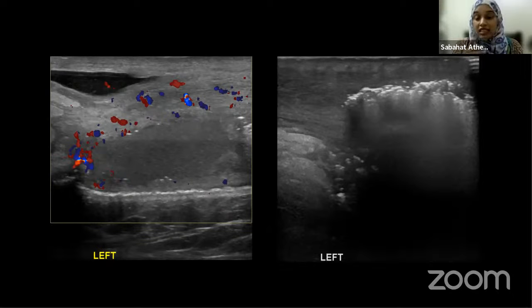You see, this patient had Fournier gangrene. What we are seeing here, he had diffuse scrotal wall edema. He was oozing pus. And if you can see here, these are all air foci with very dirty shadowing. And this is a collection here.